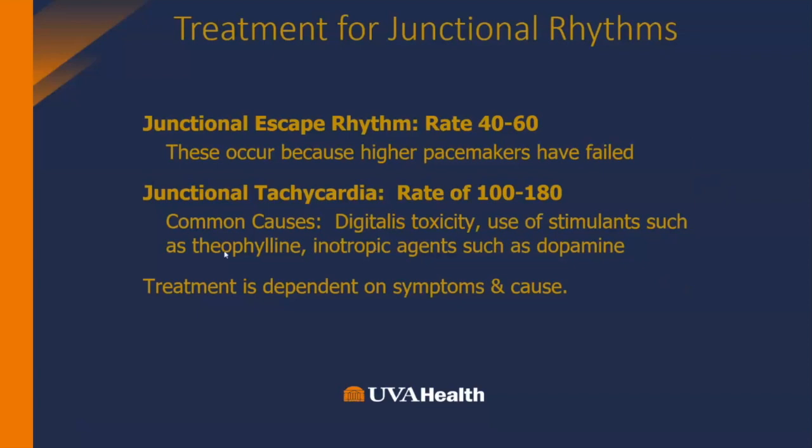Again, conduction system failure. A lot of times post-resuscitation, it's not uncommon to see a junctional rhythm because it takes a time frame for the SA node to recover from multiple defibrillation attempts. So you may see someone whose post-arrest rhythm or their ROSC rhythm is junctional because the SA node just hasn't kicked in yet, needs a little bit of perfusion before it does. This can also be caused by various medications and influenced, as noted here.